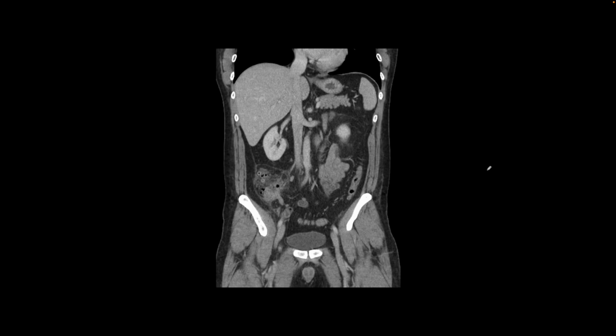They presented with right lower quadrant abdominal pain, and a CT of the abdomen and pelvis was acquired. And so we were suspecting acute appendicitis, but it turns out that they have diverticulitis involving their cecum, which shows multiple diverticuli and one inflamed diverticulum right here.